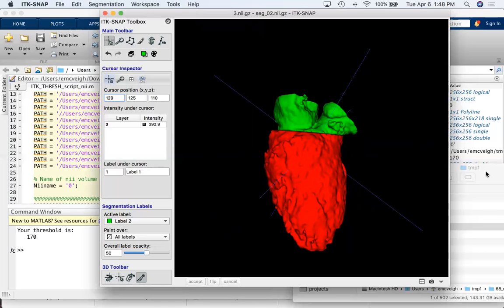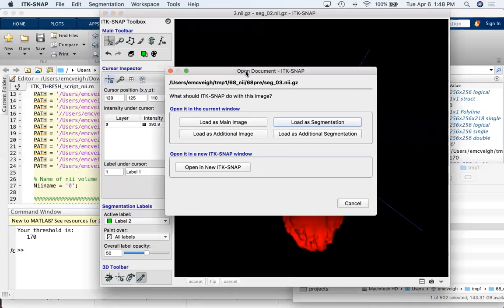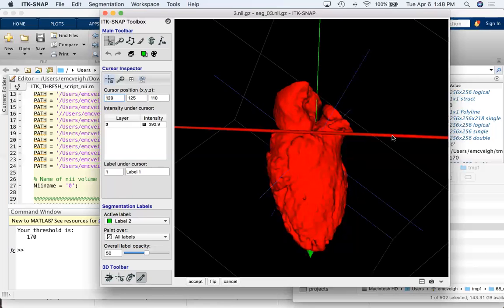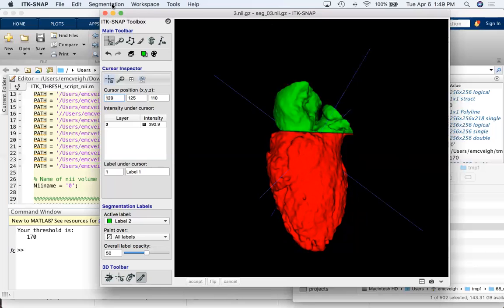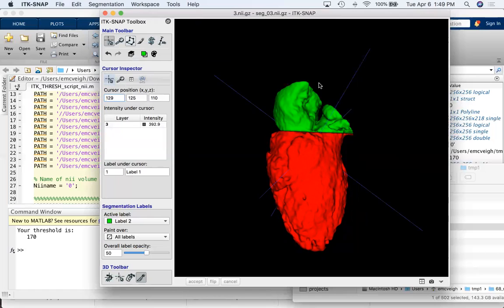And then if we drag 3 in, when I draw a plane in this image, it's going to be parallel to the previous one. I'll just draw it there. Flip, accept, just save that. I'm not even going to look. I'm going to save that.